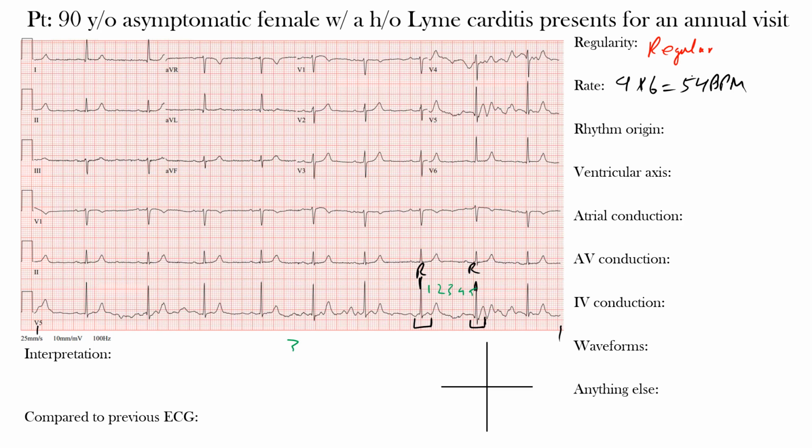So remember, 300 over 5 is 60 beats per minute, and it's a little greater than 5, so we will say that it's slightly less than 60 beats per minute, but close to that. And the actual rate on the EKG machine measured 57 beats per minute. So you can see that we were quite close. 57 was the actual ventricular rate here. All right, so we'll erase this.